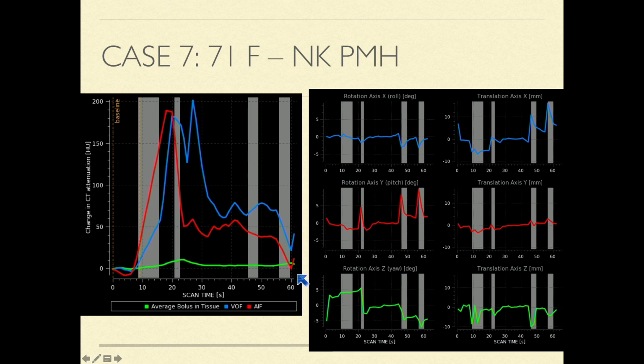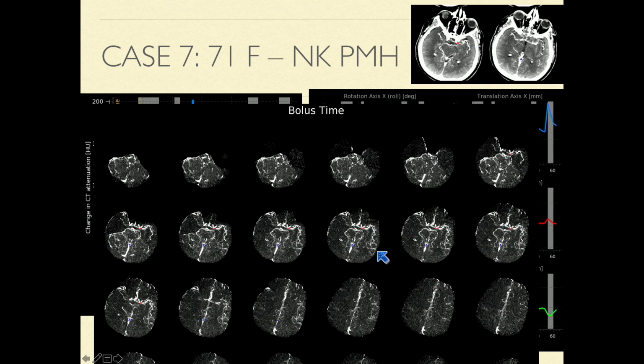And this is what her curves looked like. In fact, I showed you, I think, this one yesterday. And this is what her AIF and VOF curves look like. So right away, we should think, wow, I'm not sure that I can really believe the data because there's just so much motion. So right away, we should think, I bet I'm going to generate a report that's non-diagnostic here. But let's just see what happens.